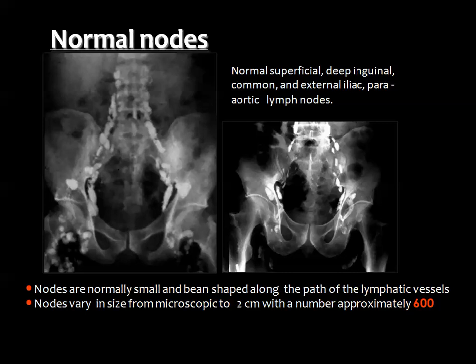During or after we finish injection of contrast, we take films for the appearance of the lymphatic vessels. And the next day we will have other films for the lymph nodes, what we call the nodal phase. This nodal phase will show the lymph nodes in the pelvis and also the lymph nodes in the abdomen.